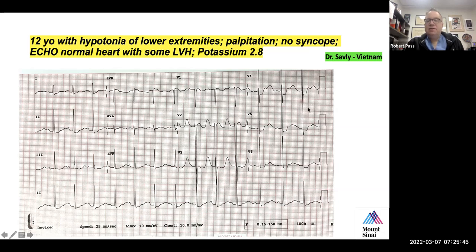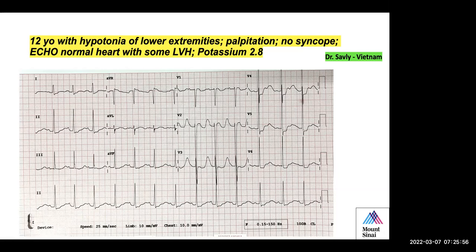So I'm going to ask Dr. Bonsall if you have any thoughts about this tracing. Good morning, Dr. Bass. How are you, Dr. Bonsall? Good, thank you. So it looks like sinus rhythm, regular.